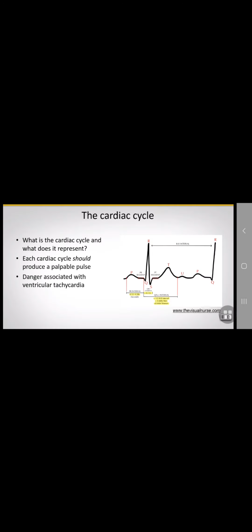So when are we actually going to get to cardiac rhythm strip interpretation? Well, if this describes what you're thinking at this point, then this video is for you. The graphic that you see on the screen provides an overview of the cardiac cycle, which is a fancy term that describes the events that compose a single heartbeat. This includes the preparation for the next beat or cycle.